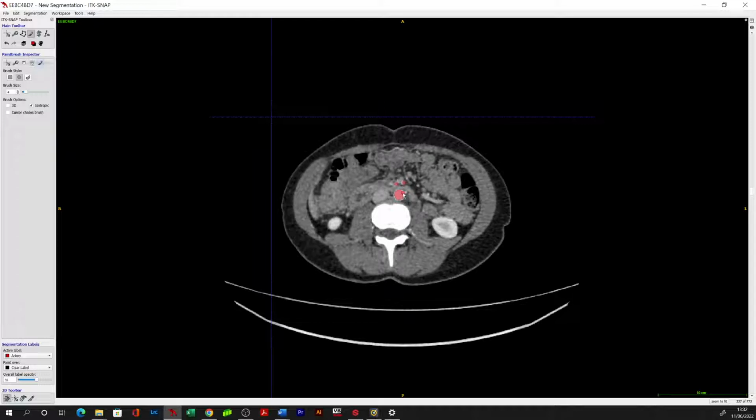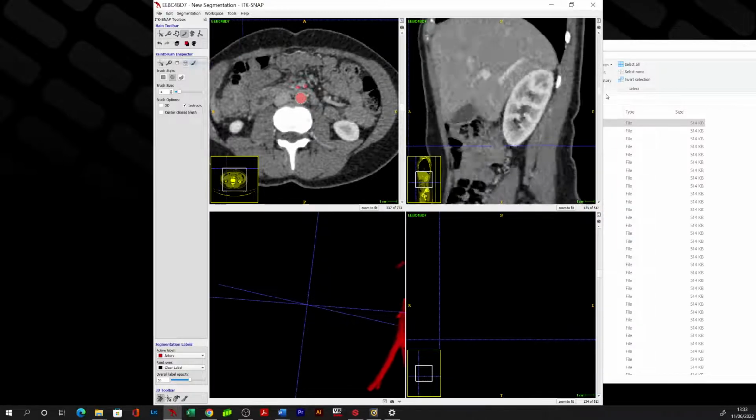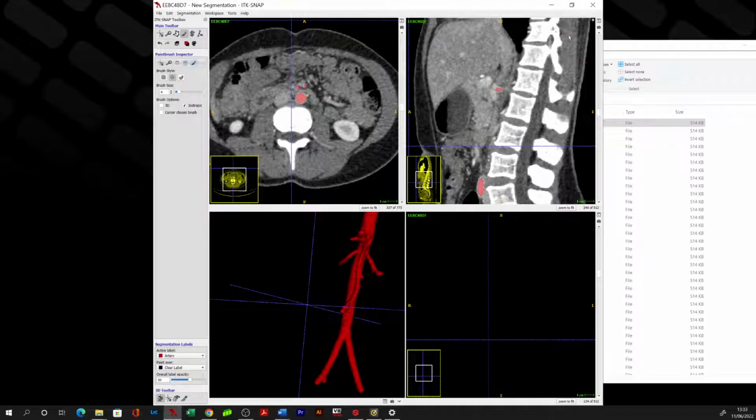And you also have the luxury that you don't have if you're trying to figure out what's going on purely mentally, that you can flick back. If you click these icons, they let you enlarge a certain area. So if you click on A, this will make the axial view occupy the entire screen. If you use the sagittal, that would increase the sagittal.